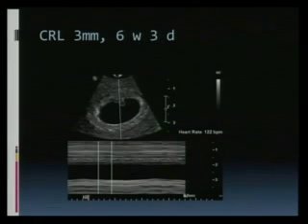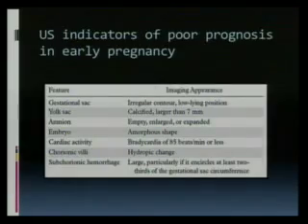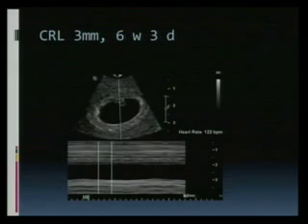It is vendor specific. Like, if I have to choose it manually, where exactly the... One cardiac cycle. So here, she has begun right here, at the beginning of this peak, gone to the beginning of this peak, right here. So this is one, this is one, this is one, this is one. Okay. So as you can see, this is one, this is one, this is one. Okay, it is not hard to tell.